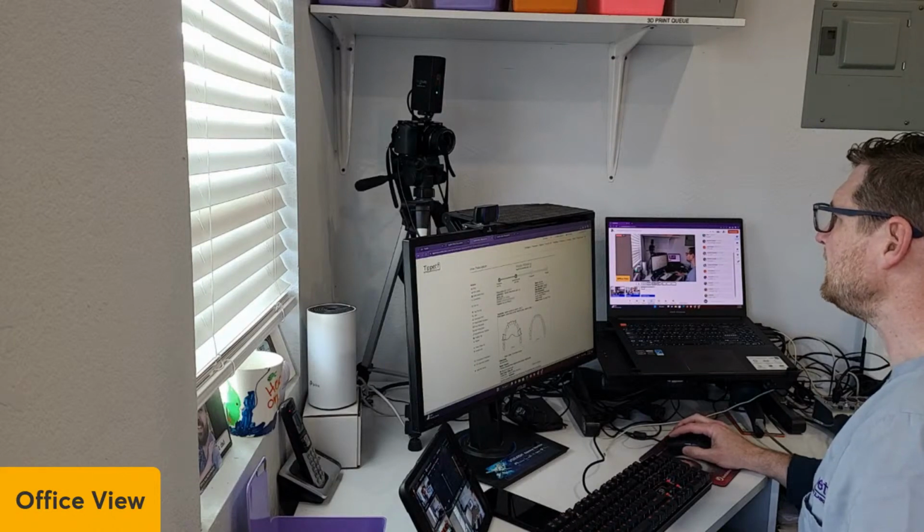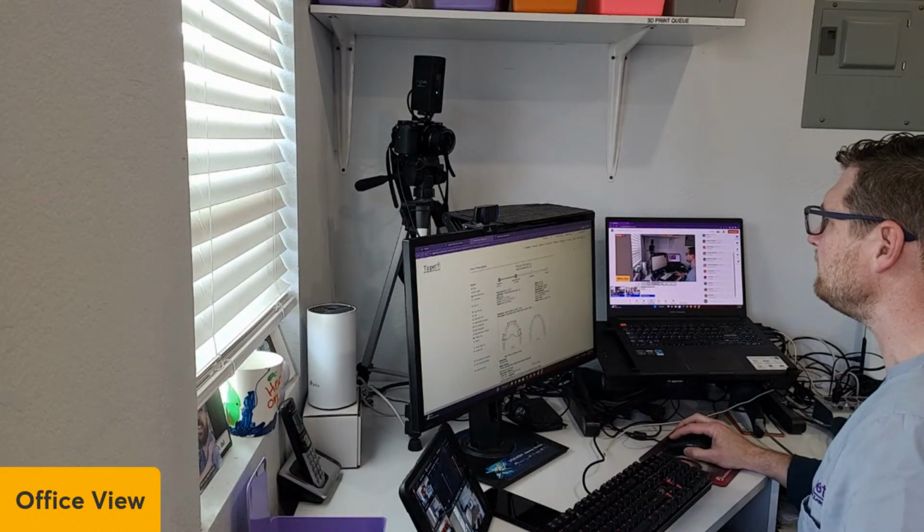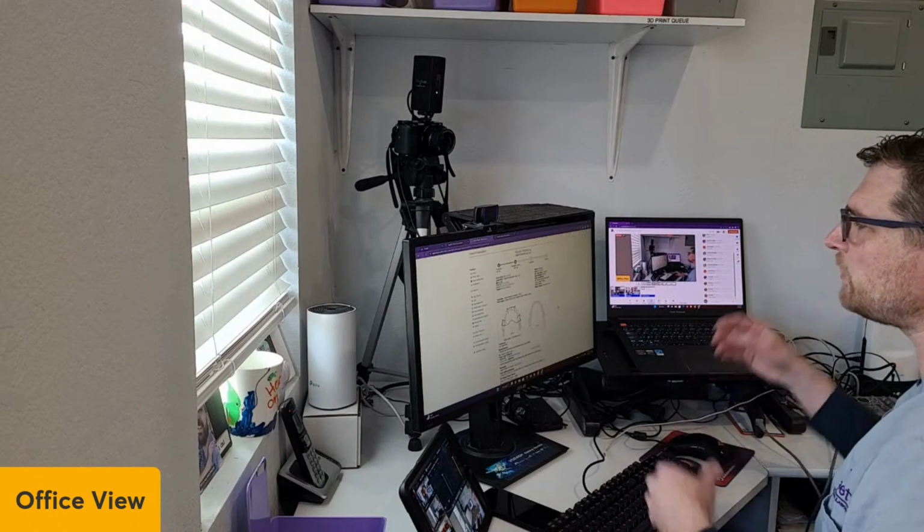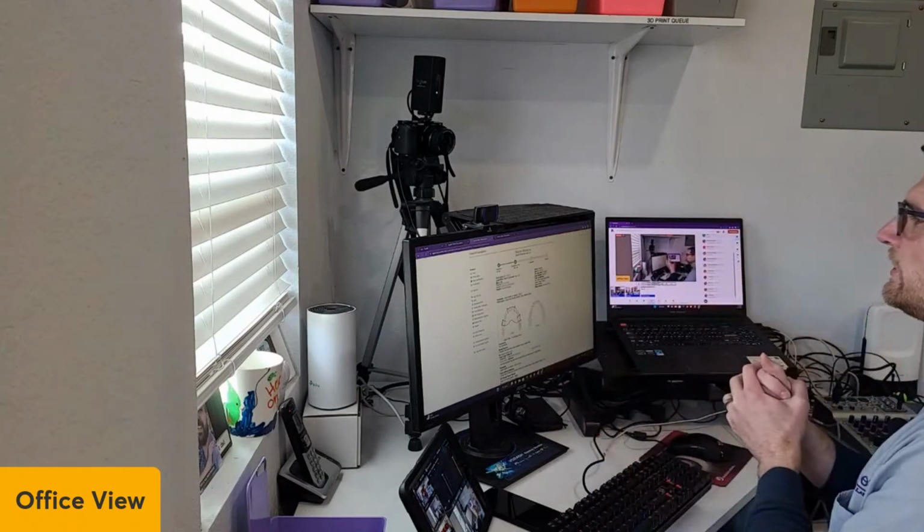Again, this is what we have to deal with. That's why you don't see much of labs showing their screen. It's mainly just HIPAA things, but I wanted to show you an actual case. So we have the case here.